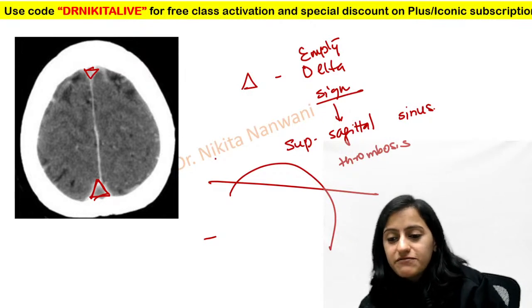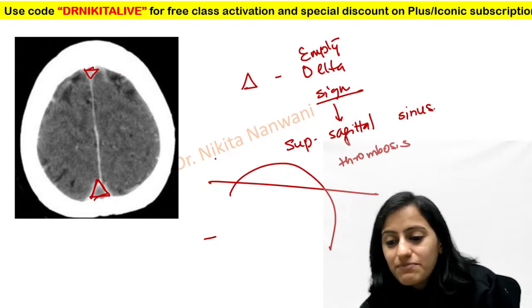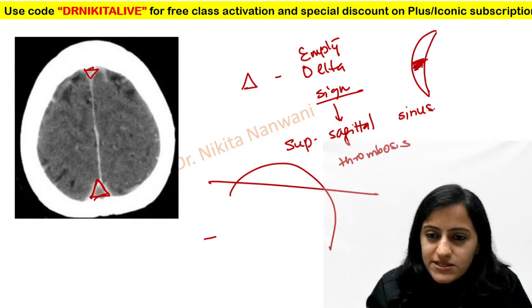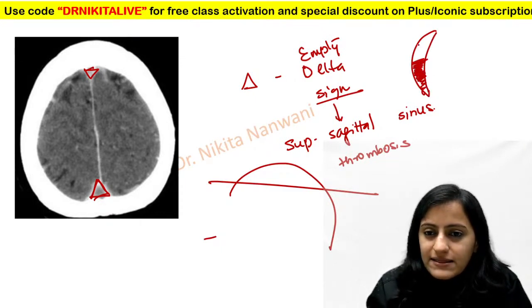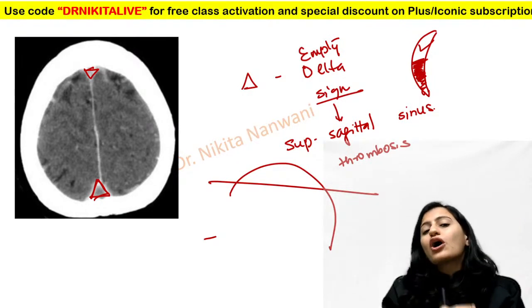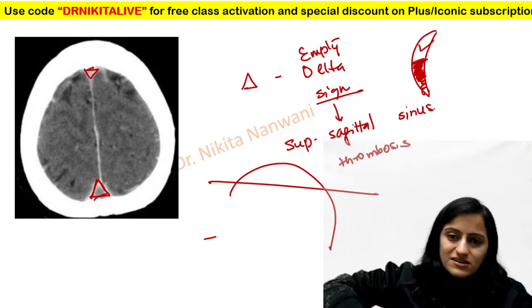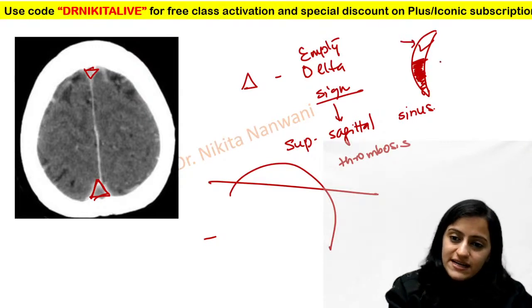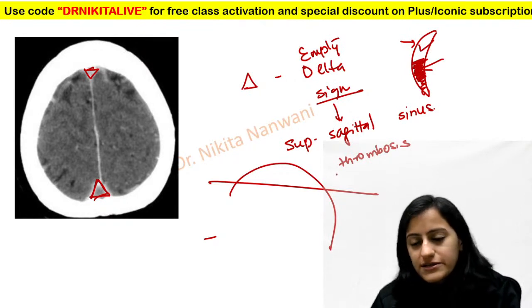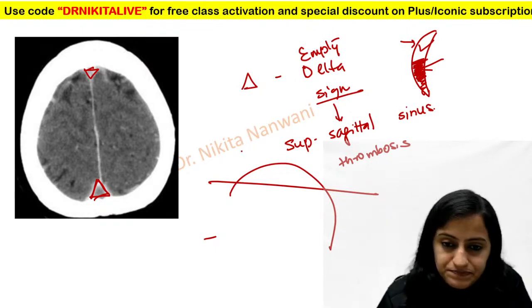Okay, Dr. Avi, if you had an image in FMG showing half black and half white SDH, if the image was like this, so this part is white and this part is black, basically this is your acute on chronic SDH. So the dark one is the chronic SDH and you have the acute SDH in that. Okay, so it's acute on chronic basically.